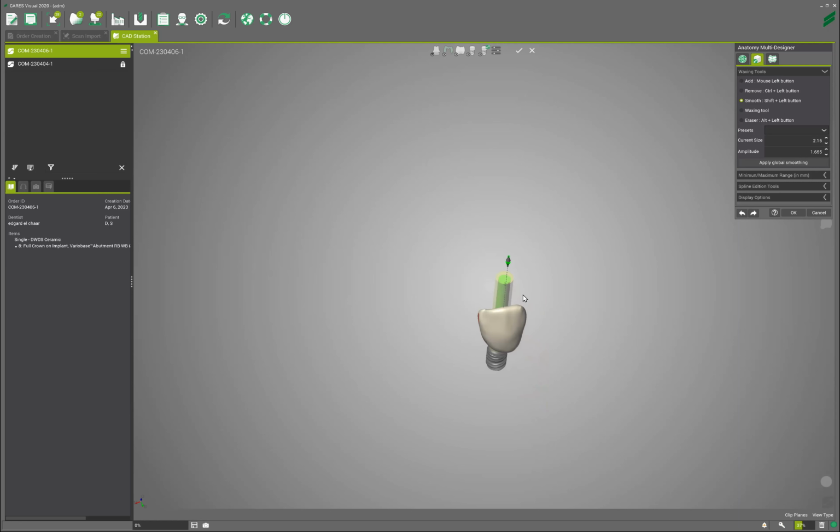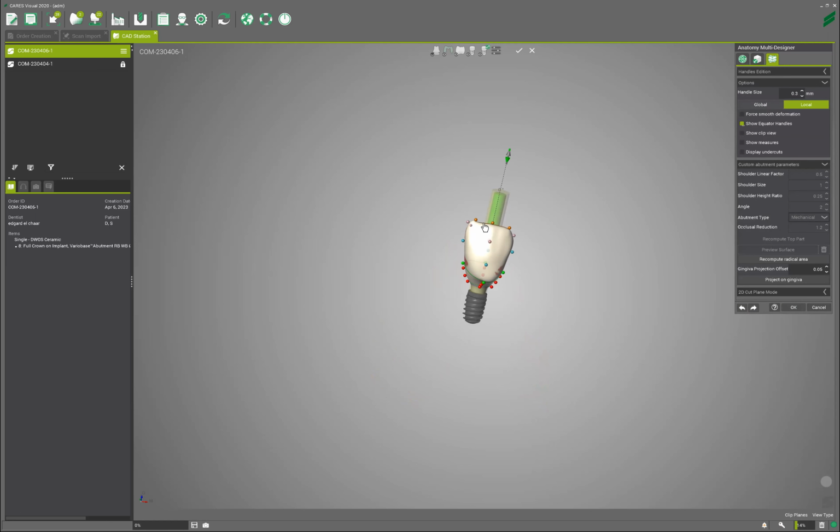Well, I tell you, with this software, it's very hard to fix those points. You can spend a lot of hours, never gonna do them. Look at it. It's actually made it even worse. So, okay, that's all right. Let's not waste our time. This will be done on the bench or clinically. I can put points and see if I can fix it. See here, I can make another point and see if I can fix that. All right. And again, I don't want to make it too bulked up.